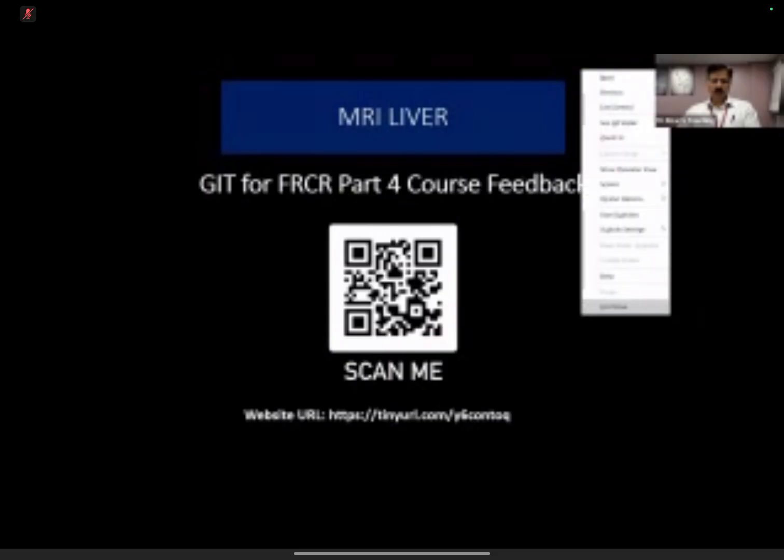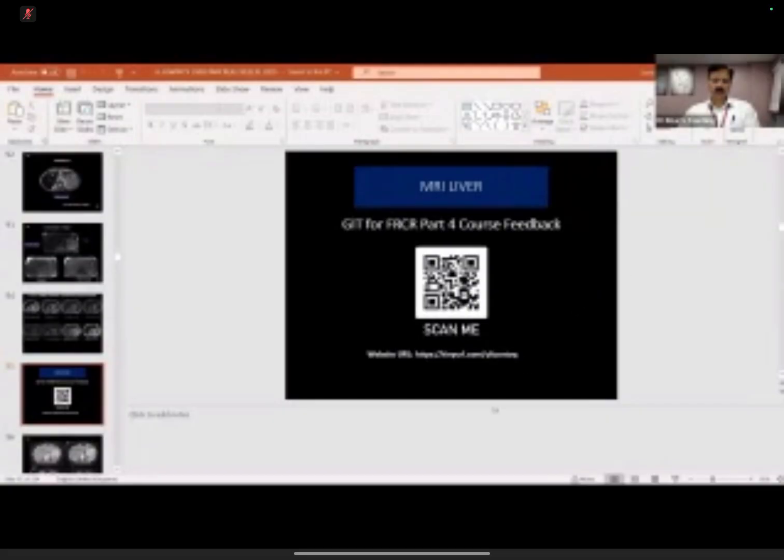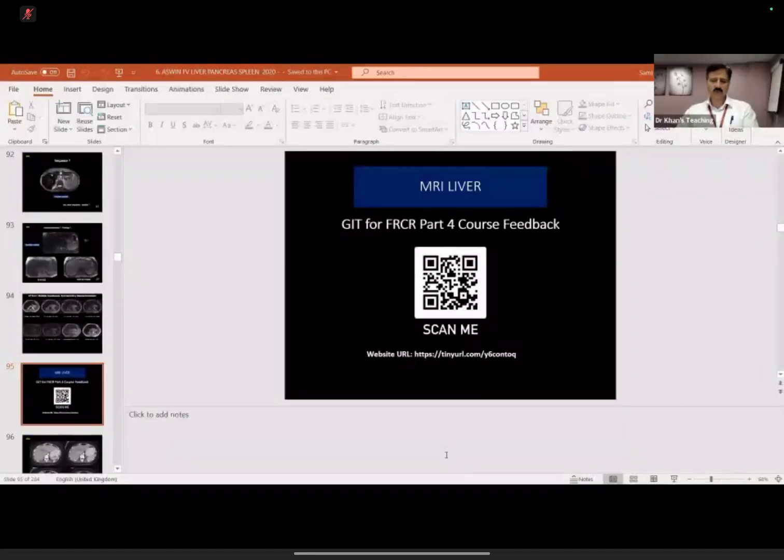Now, I am going to show you a few cases which are in a PACS type of format.